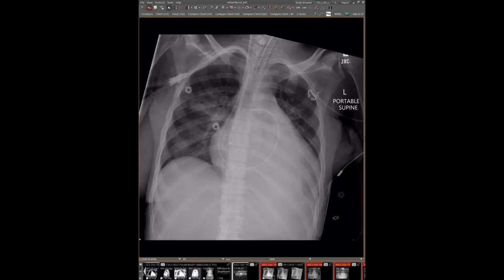Both of them are device related. So this is the first one. This is a relatively young patient who has a history of postpartum cardiomyopathy and was brought to our hospital in sort of acute on chronic cardiogenic shock. You can see that at this time point she has ECMO cannula in.